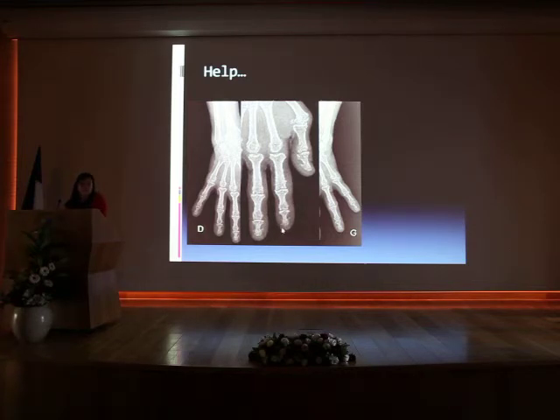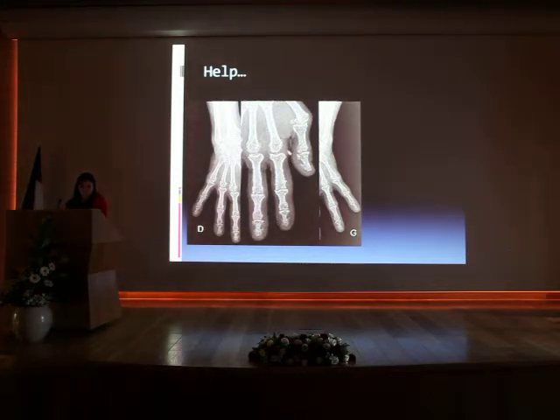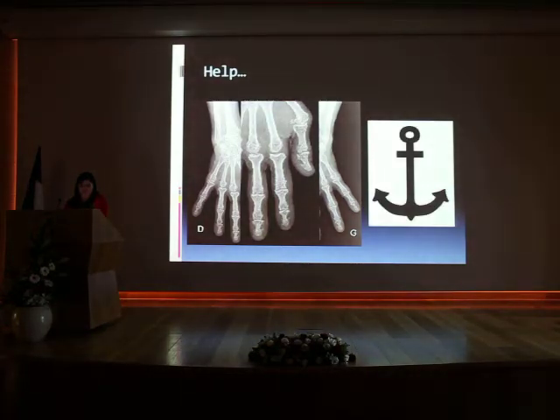What do you think about it? Periosteal reaction, soft tissue swelling, and bone formation. But look at the shape of the tuft. Spade-shaped tuft. Let's focus here also. Do you think it's a normal space? There's a periosteal reaction.